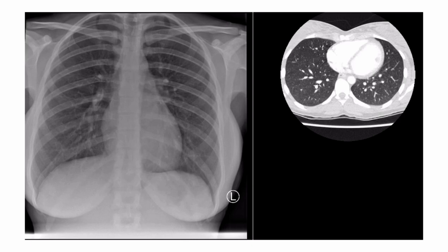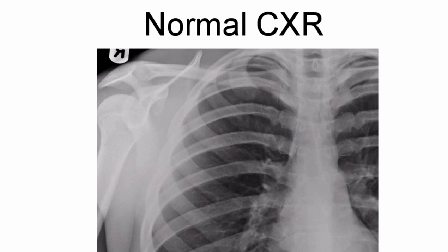This is to illustrate that when the X-ray beam from a point source diverges and projects onto the heart tangentially, we can make out the right and left heart borders against the lungs because they have different radiographic densities. This is a normal chest X-ray. You can see the blood vessels in the lung because, again, they have a different radiographic density to the surrounding lung tissue.